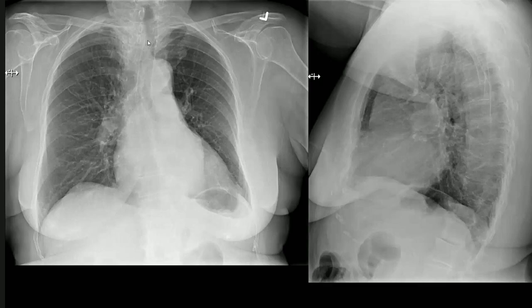Yes, sir. Just go through the trachea. So you're looking at the lucency of the trachea over here. That's the right main bronchus. What's happening to the left main bronchus? Sir, it is tapering towards its end, with normal proximal caliber.